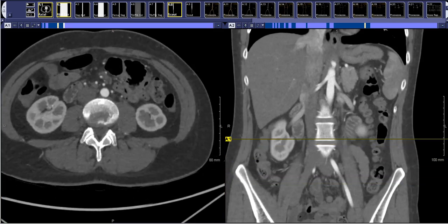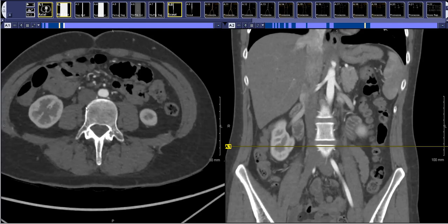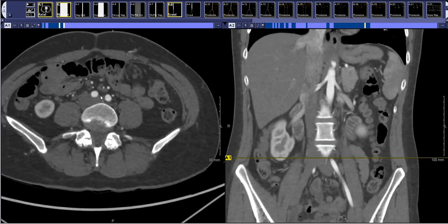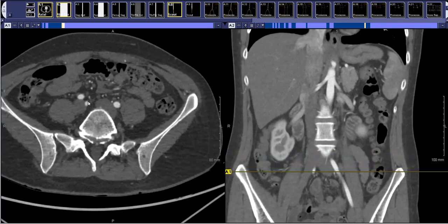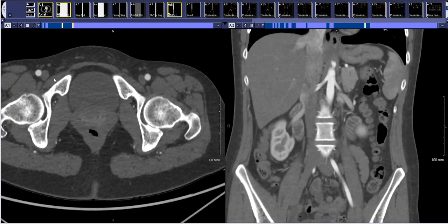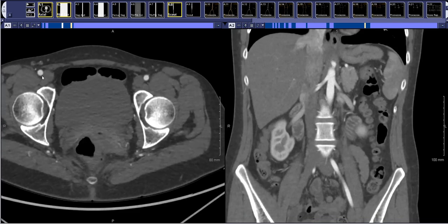So at this point, once we've reached the aortic bifurcation, I take it side to side. So we'll go through the right side as an example, but really the left side would be done in identical parallel fashion. First, you comment on the right common iliac artery, its bifurcation into internal and external iliac arteries, and then as it crosses the inguinal ligament, it becomes the femoral artery.